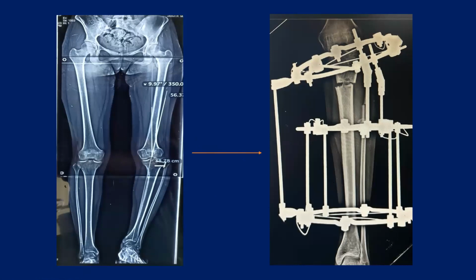So, as Dr. Puri rightly said, all her lesions and pain resolved over a period of time, but it left behind these deformities and shortening, which we required to correct with a frame. So this was an interesting case. This is a 10 years follow-up, Mandeep, if you remember.